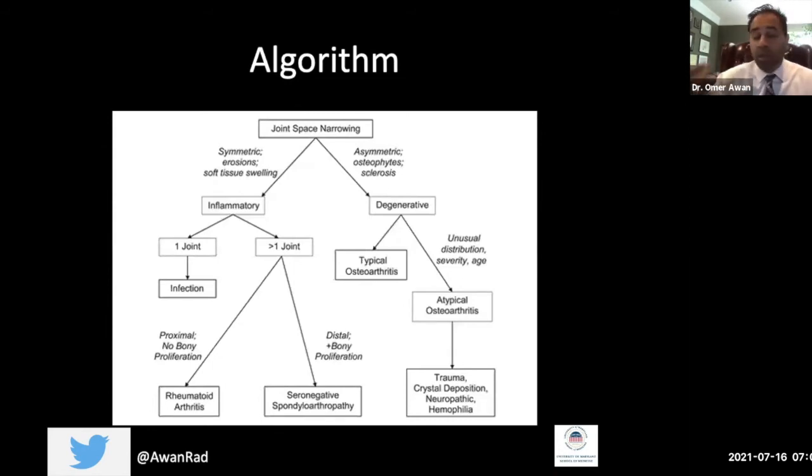We do use CT and MRI to evaluate arthritis, but really the mainstay of evaluation for arthritis is a plain film, because that's what we do in general practice, right? So I really want to just show you guys plain films, and quite frankly, plain films are hard to interpret, right? In my opinion, I think cross-sectional imaging is very easy to interpret, but plain films is a little bit tougher. So that's what we're going to spend most of our time looking at: radiographic manifestations of arthritis.